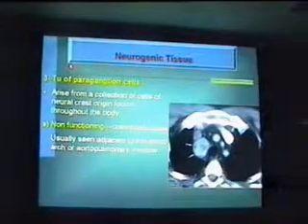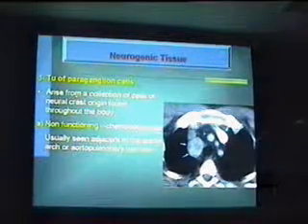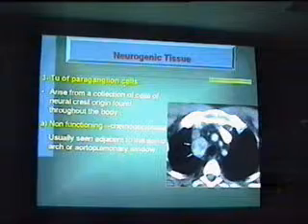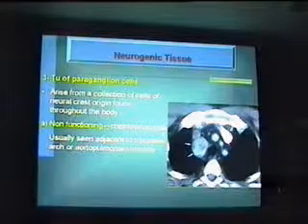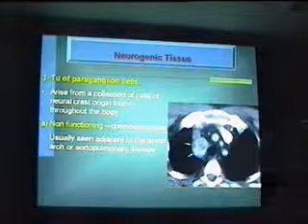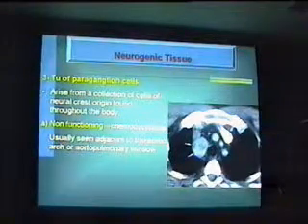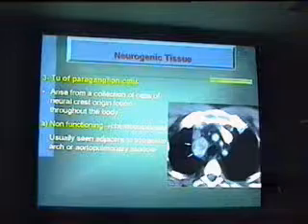يبقى ثالث tumor من الـ neurogenic tumors هي tumors of paraganglion cells arise from a collection of cells of neural crest origin found throughout the body, not only in the intestine. بنقسم الـ paraganglionic cells دول لـ functioning و non-functioning. الـ non-functioning زي ما احنا عارفين هي الـ chemodectomas usually seen adjacent to the aortic arch أو aortopulmonary window. That lesion محدش يقدر يقول أبدا إن this is a chemodectoma بأمانة شديدة، especially إنها non-functional ما عندهاش كمان clinical presentation. يعني this can be a lymph node. Anybody can call that a pretracheal retrocaval lymph node easily. Okay?